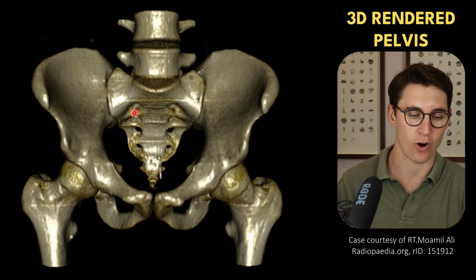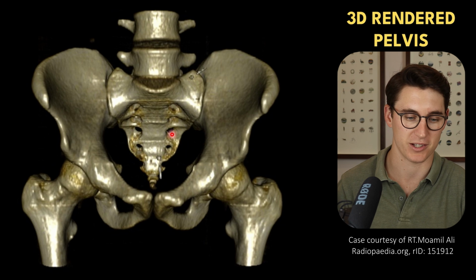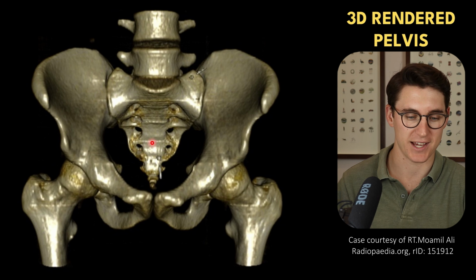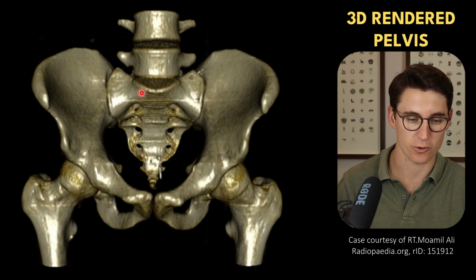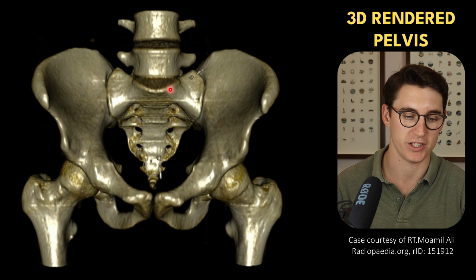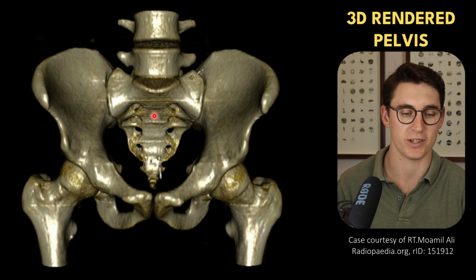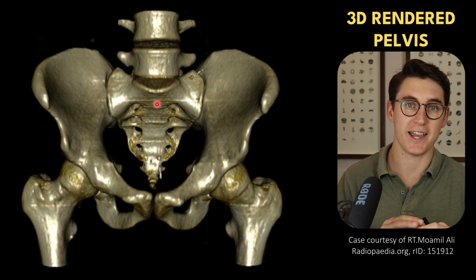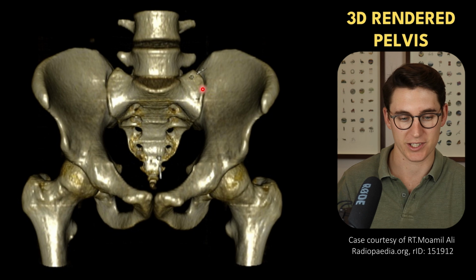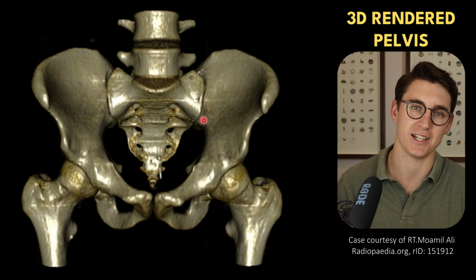our sacrum has these holes or foramina anteriorly, which are anterior sacral foramina. The sacrum curves, it's a concave shape like that, and superiorly on the sacrum we have this bony outcropping known as the sacral promontory. And that makes this distance here, the AP distance, quite narrow within the pelvis. Our sacral alae then spread out laterally towards our SI joint, our sacroiliac joints, both right and left sacroiliac joints.